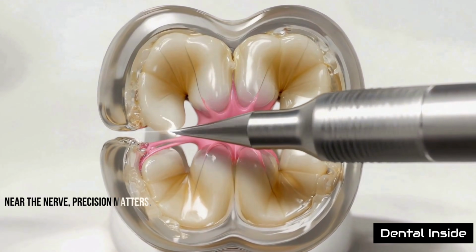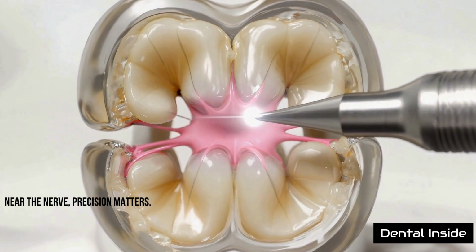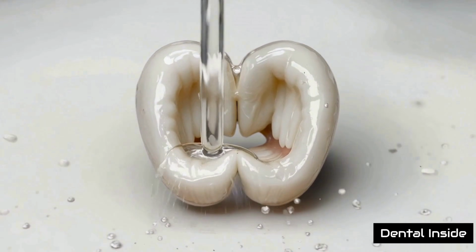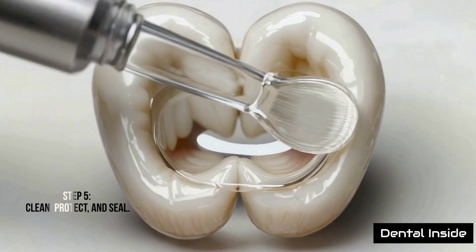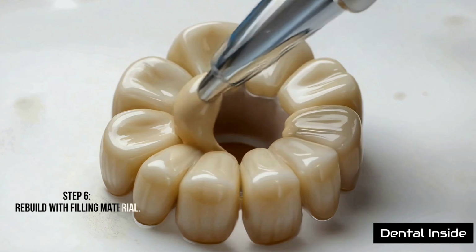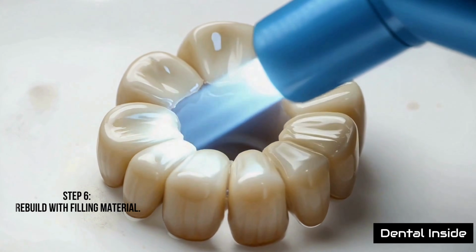If decay is very close to the nerve, dentists may slow down and protect the pulp instead of over-cutting. After cleaning, the cavity is disinfected and sealed with protective materials before the final restoration begins. For many deep cavities, tooth-colored filling material is layered and hardened to rebuild the missing structure.